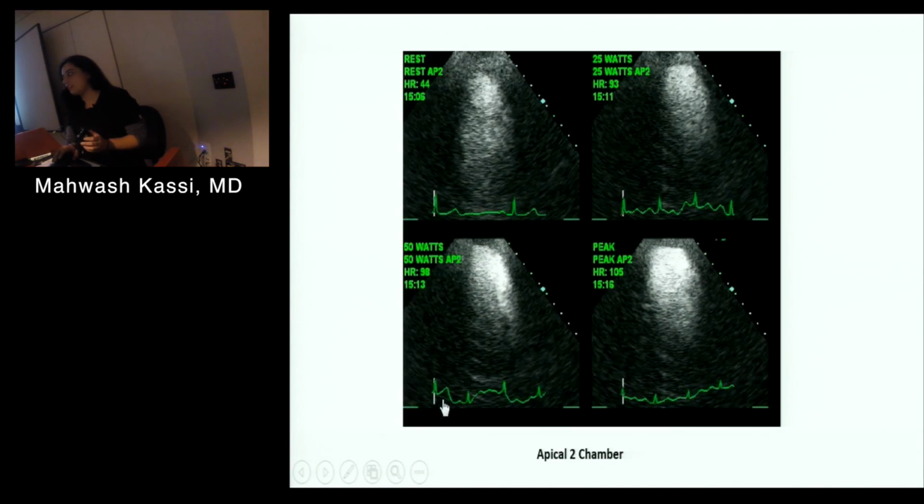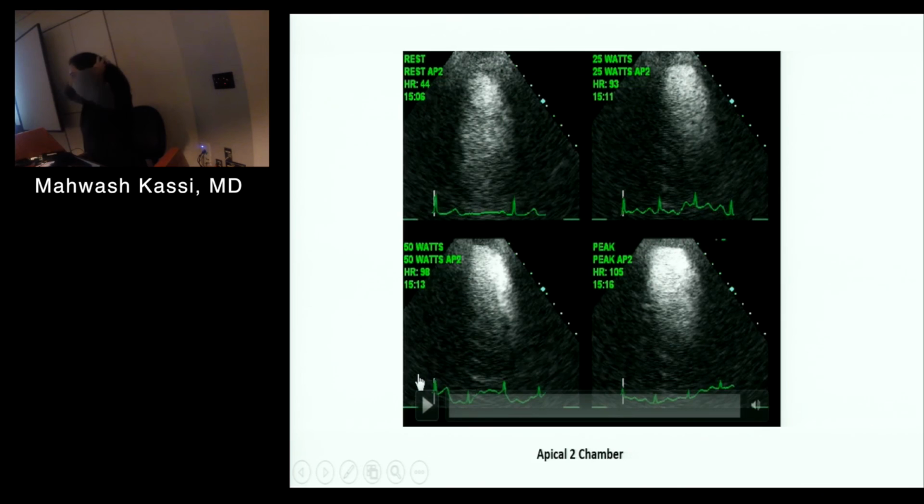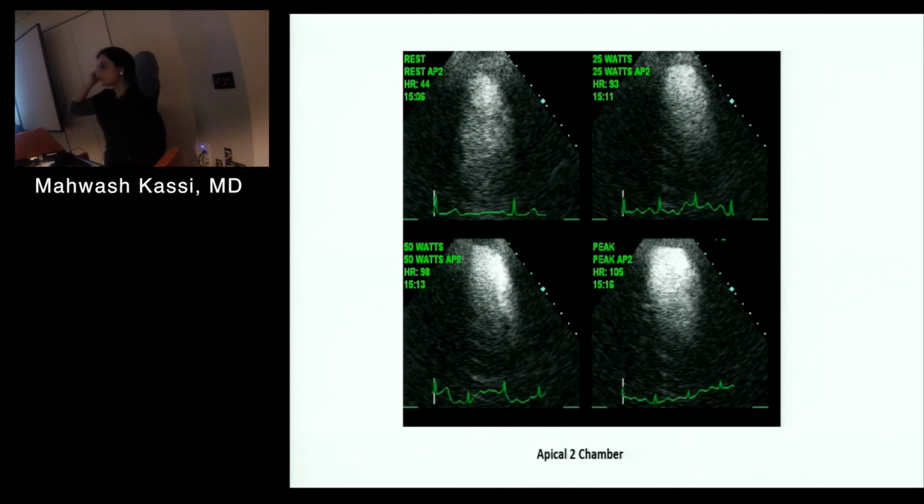So you've got the lateral apex, the mid-lateral wall, and you've got the anterior apex and the mid-anterior wall. What disease do you think this patient has? Which artery? And we just went over this. Tell me the answer. You get the LAD, right? Yeah, that's right. LAD's one. Well, it wouldn't be distal because it's taken down your mid-anterior wall and your apex. So it's going to be at least mid, and then what other artery? Because it's taken down your lateral wall too.